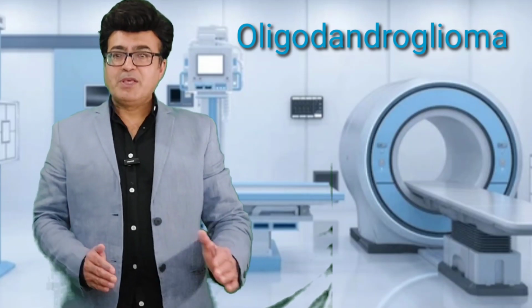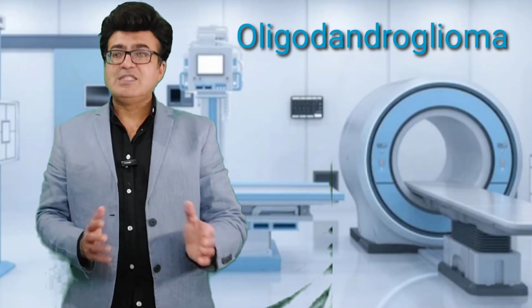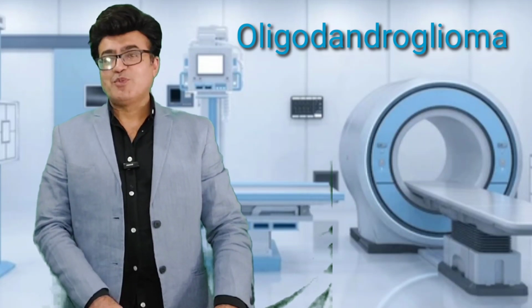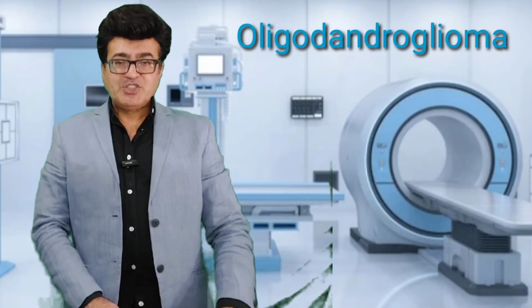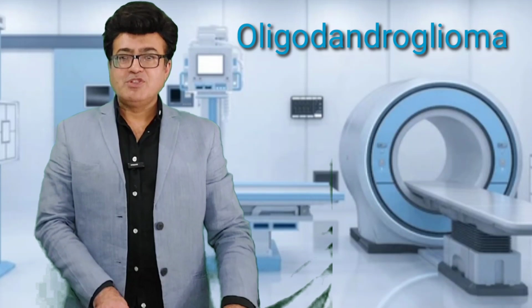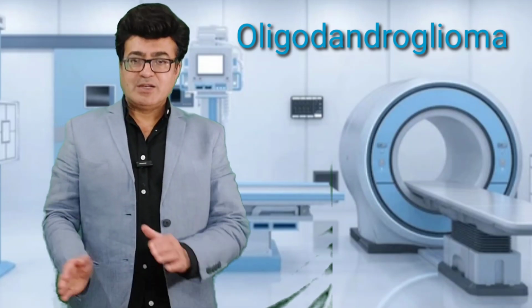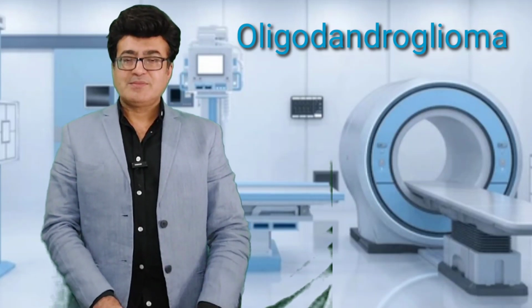So how will it appear on ultrasound imaging, and how will it appear on CT and MRI imaging? We cannot see that on ultrasound imaging. So we are going to look at the CT scan and MRI, and how we will appreciate it, what the characteristics are on the CT and MR images. These next slides will also explain all these categories. So let's start watching these images.